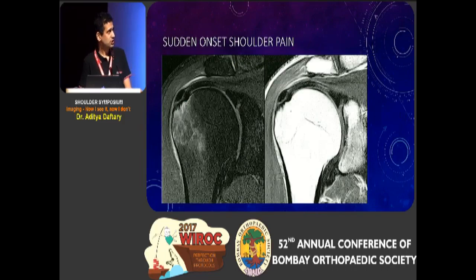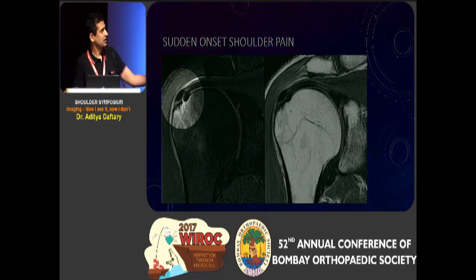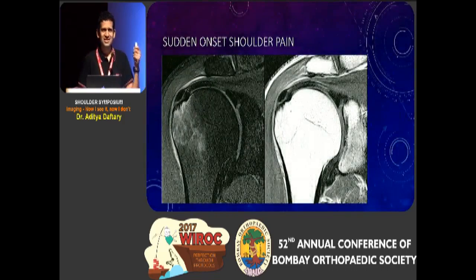And then here's a patient where, if you didn't know any better, you could say that this person has essentially what looks like a rotator cuff tear with edema here, and there's a split in the rotator cuff and there's subacromial bursitis. Whereas this is actually a globular focus of calcification, which has the exact same signal as the adjacent tendon, and this can be easily mistaken.